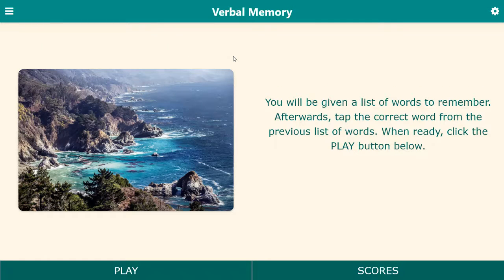Each game will first provide brief instructions to the user on how to play the game. The temporary image on the left consists of visual instructions in the form of a video or animated GIF, and is complemented with text-based instructions on the right. The user interface uses a simplistic design to emphasize ease of use. It is composed of a top header bar for the title and page navigation icons, the main content in the center, and a bottom button bar with two buttons for easy navigation.